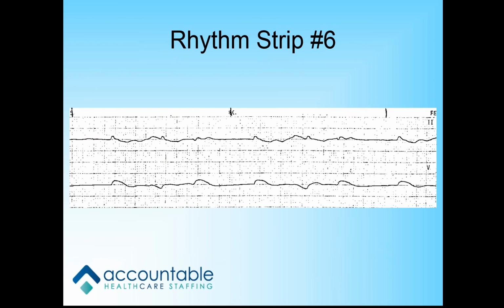Oh, lucky me. Okay. At a glance, is this a lethal rhythm? Yes. What would you call this rhythm? VFib? Take a closer look. Is it really fibrillating? You do have some P waves in there. You can actually identify them going across there. If you have the P waves, but they're not communicating anything, nothing's happening with them, what do you have then?